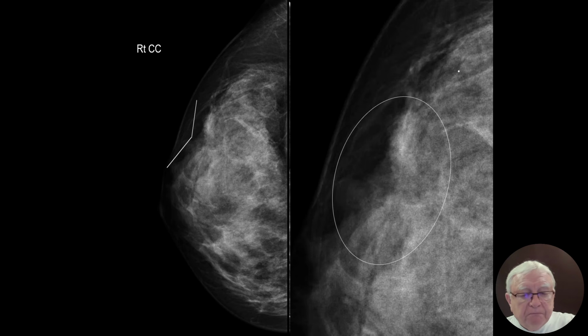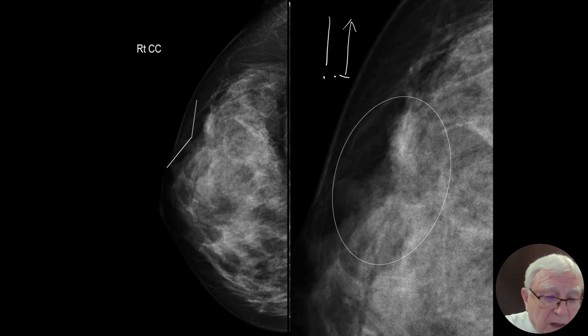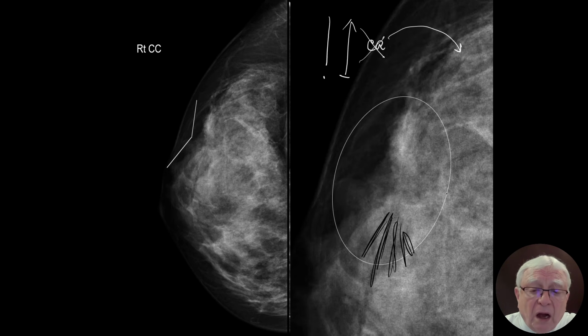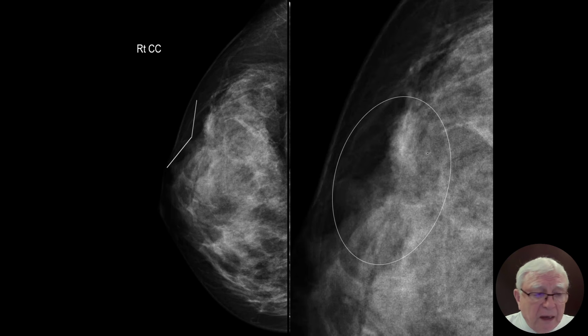What would you do? Well, of course, you palpate it, and you don't find something. Now, be careful. You are influenced. High risk family. You only think about cancer. Would you mind putting this on the back burner? There are benign cancer mimicking lesions as well. And this one, for my eyes, is a radiating structure. And it's so big, and I still don't see a central tumor mass.